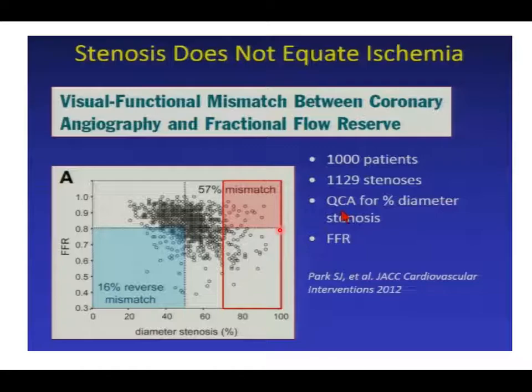And so here's your real mismatch data where you have these very high stenosis and very little pressure drop across them. And so that's where you have this situation. It has to be that these collateral vessels are feeding the territory that vessel used to feed, right? And so when you ask for more flow, it just doesn't need to give it.